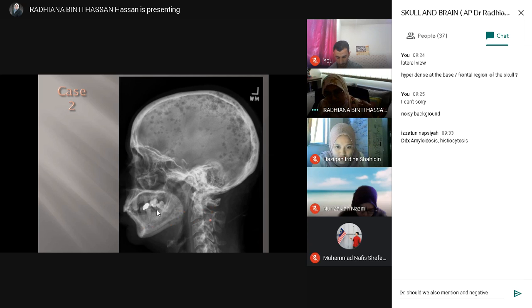And the visualized cervical spine also has all these lesions. Otherwise, I think the scalp, there is no soft tissue swelling. There is no periosteal reaction. The paranasal region also looks okay. So this is quite common, multiple lytic lesions in our setting.